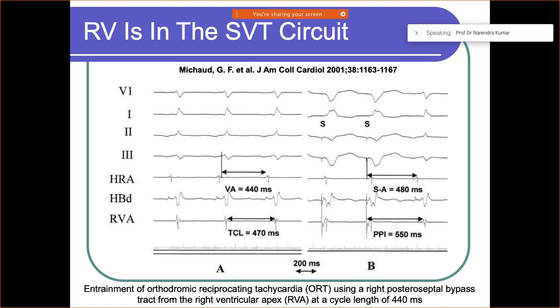So now, a basic question comes: is the RV forming a part of the SVT circuit or not? This is taken from a really beautiful paper.